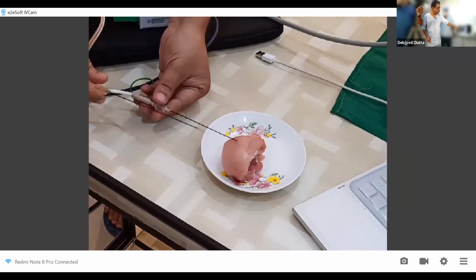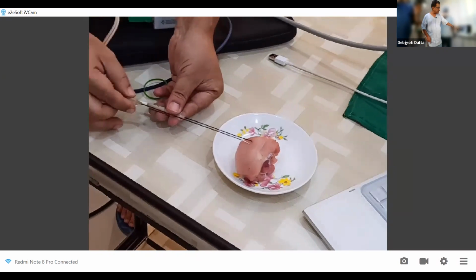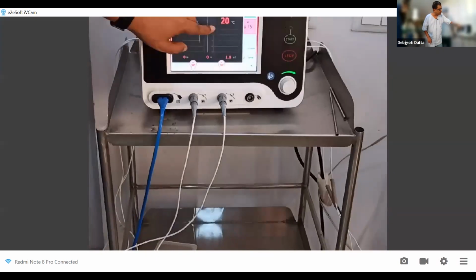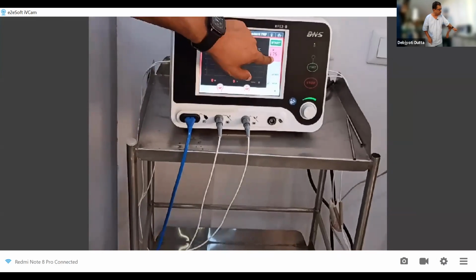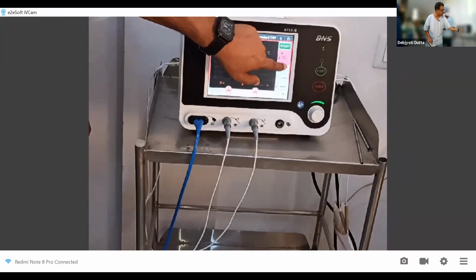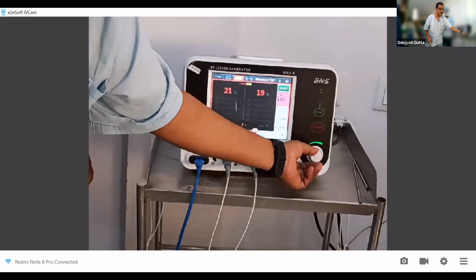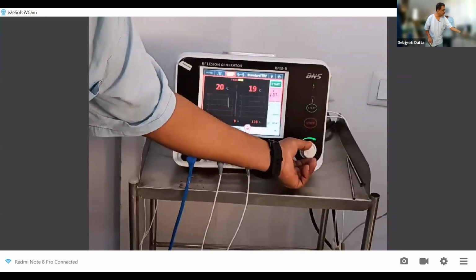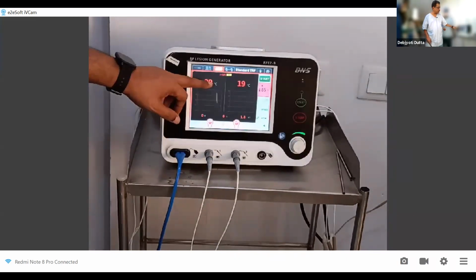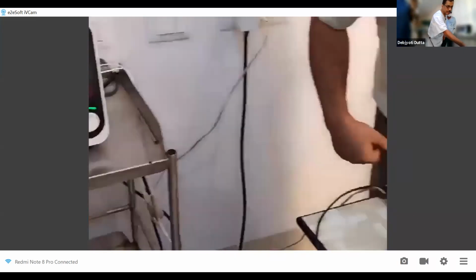So now when you are choosing 2 electrode bipolar, you can see the 2 electrodes are showing, the 2 different tip temperatures are shown. The tip temperature we have chosen at 75 degree, I can make it 80 degree, I can change it further by decreasing. You can see this is changed. So I am making it 85 degree. And you can see one tip temperature is 20 degree, another tip temperature is shown, so you can see they are connected.